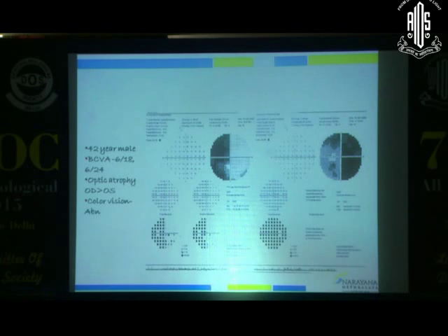Now what is this case? We are looking at one field. Definitely this is following a vertical meridian. So we know that this is a neurological field. In this eye, if you look closely, this is also having more density temporally. That means it's following the vertical meridian, but this has involved nasal. And I told you that there's an exception in heteronymous cases where the entire nerve can also be involved. In which conditions?